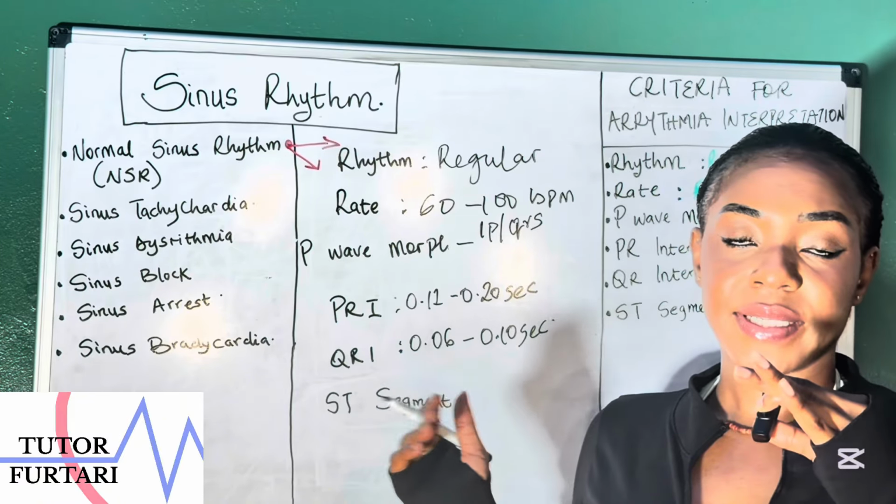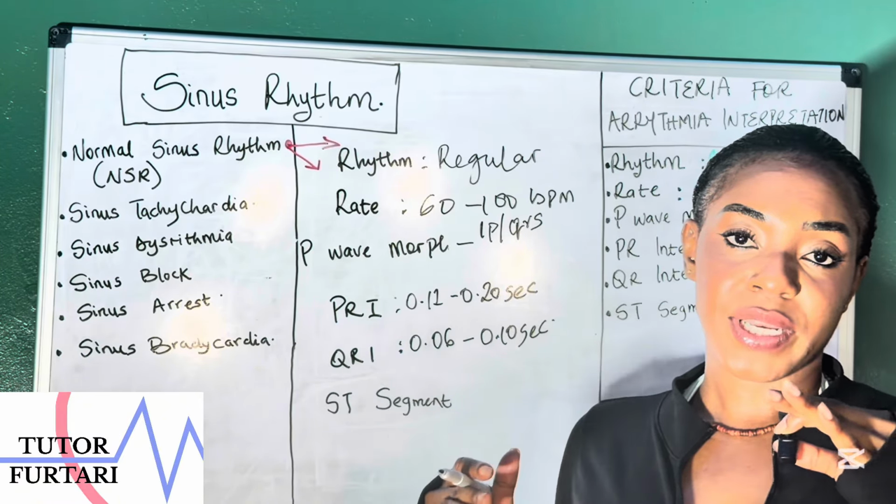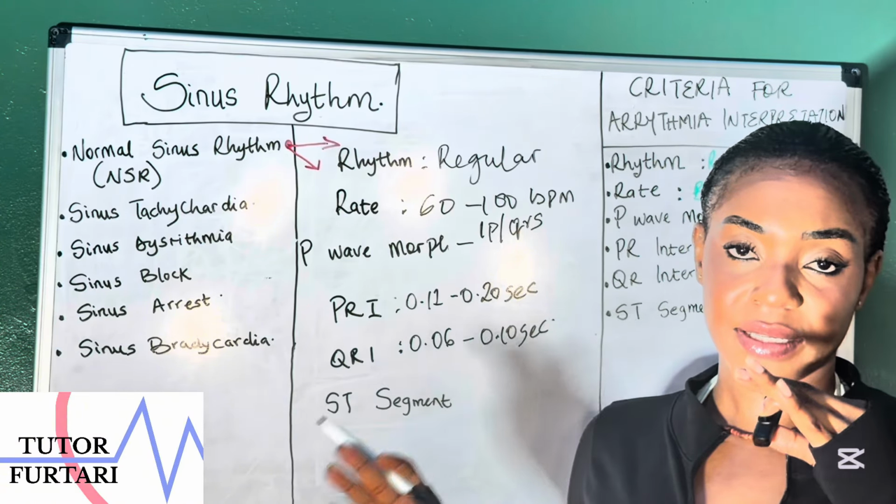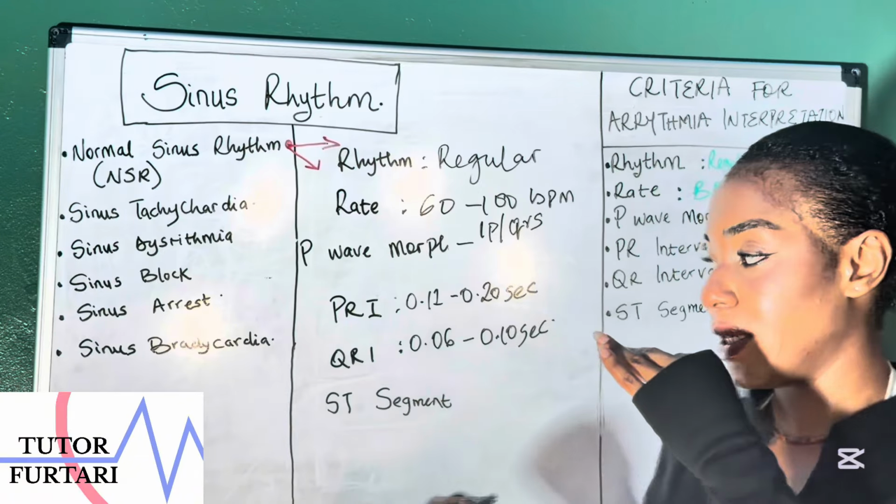There's some QRSs that can be wide and bizarre, especially when it comes to ventricular rhythms. That's another video, that's another topic. But once we get there, I'll explain a little bit more.